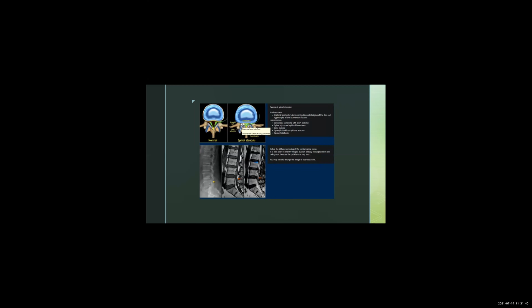This is an example of something called spinal canal stenosis. There's tightening of the canal where your spinal cord sits. So this is normal, this is not normal. You can see how this entire disc is bulging in, and all these facets are very enlarged, causing a lot of tightness. Look how wide this canal is compared to this. So this is spinal canal stenosis.